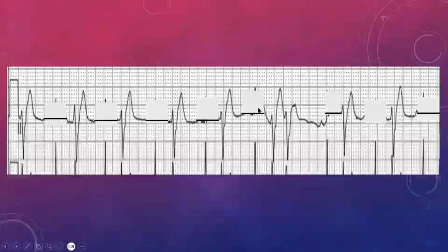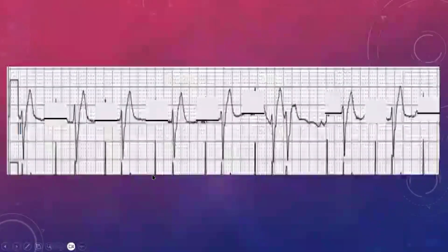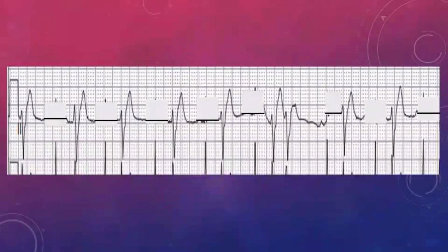So this is the scary part, and I've taken it just from lead 2 for 2 reasons. Number one, it took a lot of time to create this ECG, and I don't really feel like doing it for the whole ECG again. And number 2, it's easier just to look at it on a single line as compared to looking at it on a lot of lines as well. So let's look at the scary thing that was scaring us. So what do we notice about these things?